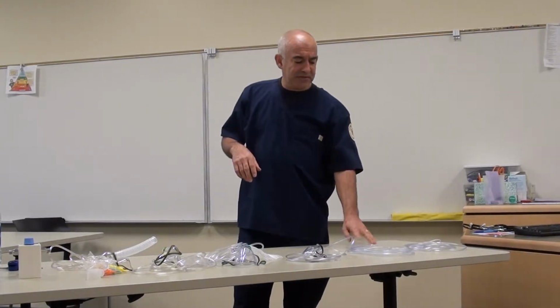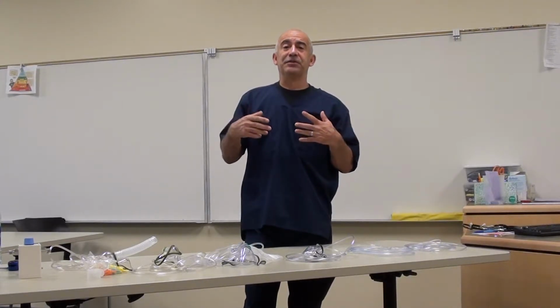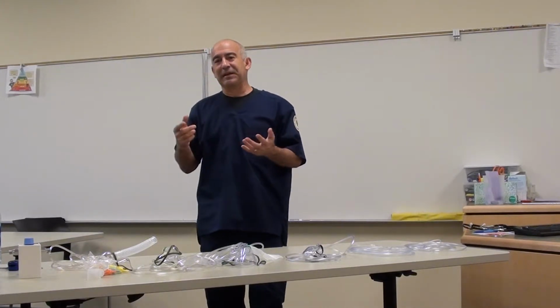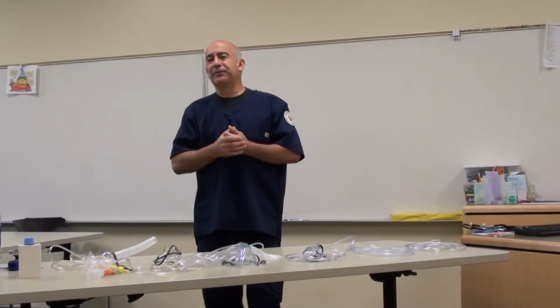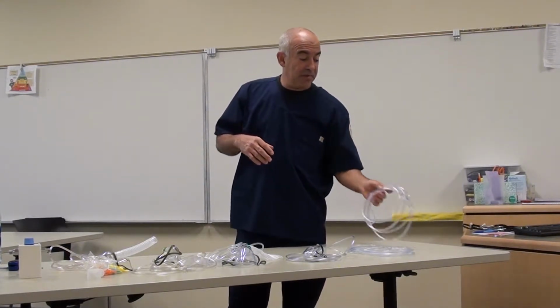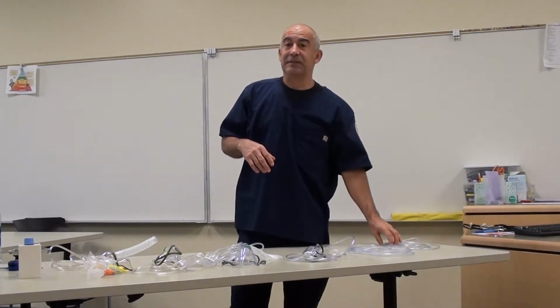Another disadvantage for this device and the nasal cannula is that if the patient is a mouth breather, somebody who breathes predominantly through their mouth. This can be for many reasons. They could have had an injury, a deviated septum in their nose, or perhaps they've dealt with allergies their whole life and they've just learned to breathe through their mouth. What that does is increase the amount of room air that the person is breathing in relation to the supplemental oxygen that's given by the device, and that lowers the FiO2.